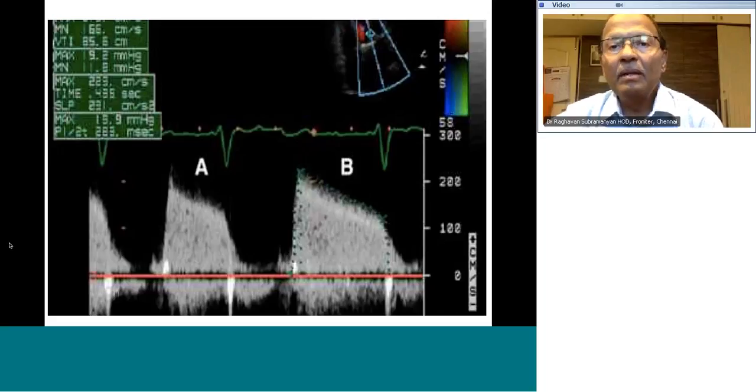So this is the class on a quiz on angiography and echocardiography. Now I'll be having more related to angiography, but I'll just start with a quick echocardiography picture. I'm going to deal with very basic things, and I expect you to answer questions quickly. You have to be fast so that we can see as many pictures as possible. Now, can anybody tell me what this signal is and what it is about?